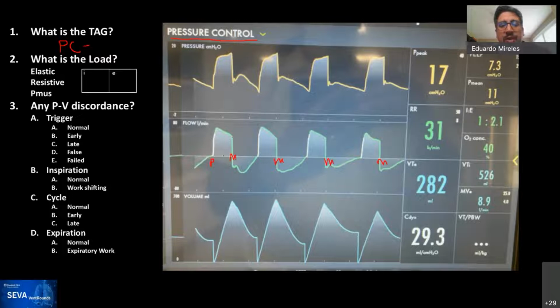So if the ventilator controls any of these variables, so controls the starting or the end, then it immediately becomes a mandatory breath. So because all the breaths that we see here are mandatory, and we don't see any other breath, this is definitely CMV, or continuous mandatory ventilation. Any questions so far?